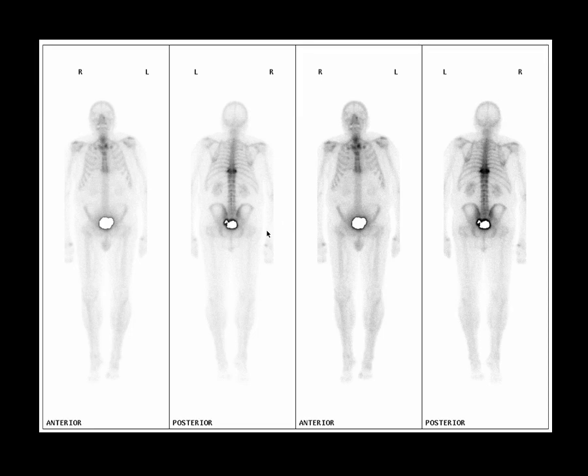Here's another patient who was coming for prostate cancer assessment, and they actually had no significant symptoms in their back, but they showed this area of increased activity, which just looks very strange really. It's based around the disc, or is it based around the center of a vertebra? It's hard to know really, but we decided to get a plain radiograph on the patient because this was many years ago when we didn't have a SPECT CT machine.